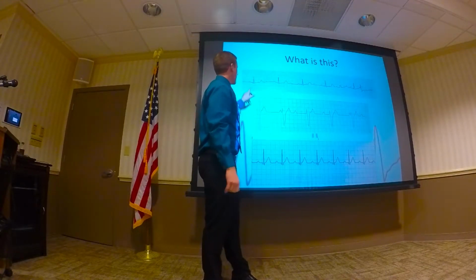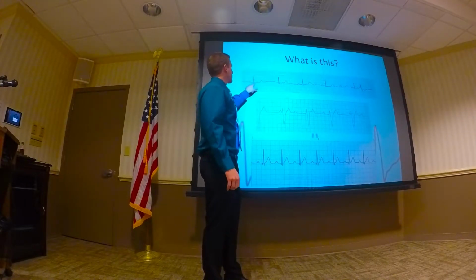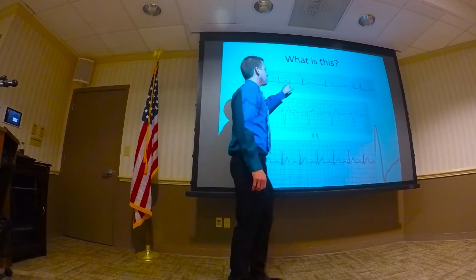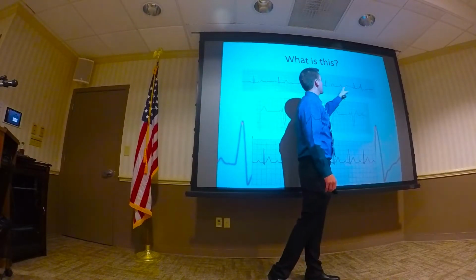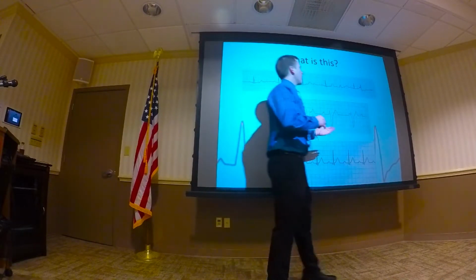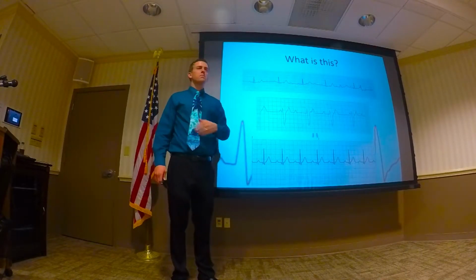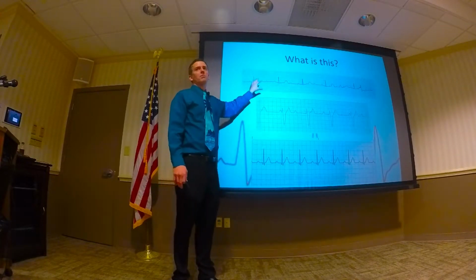And again, this is EKG, so it's not 100%, but I think that these are conducting through. Then the AV node says, that's way too early, I'm not ready for that. I'm still not ready because I have disease, and now I'm ready for that one, right? Not ready, still not ready, I'm sick, and now I'm ready. So this is what the AV node is doing. Over here, it took even an extra beat, so it's a fourth beat, and then that one went through. Here, this one went through early. So whether there's medications on board that are affecting the AV node, or some sort of AV nodal disease, something is wrong. So first of all, you stop those medications, see how the patient's doing. But this is probably a more advanced AV nodal disease and might need a pacemaker.